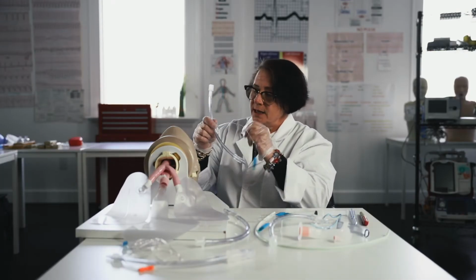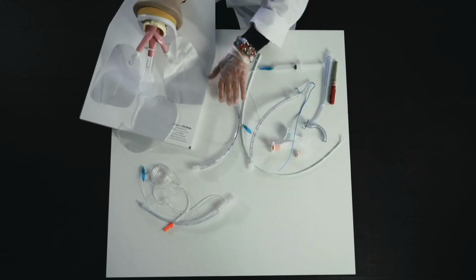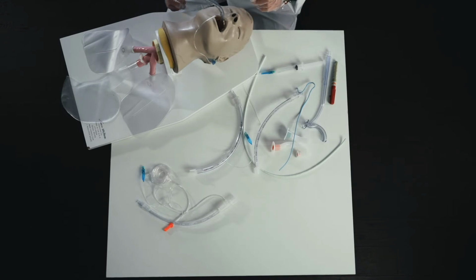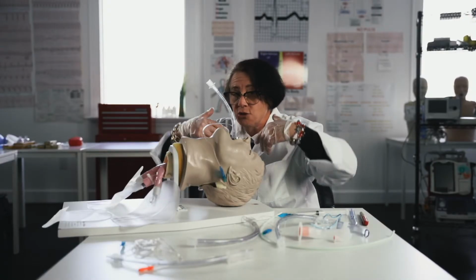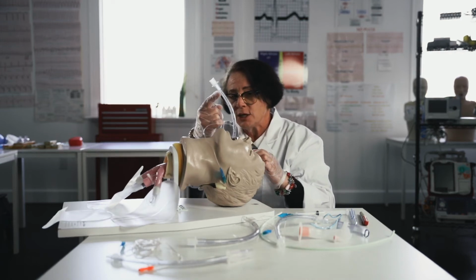So when patients are intubated, you're going to see a portion of the endotracheal tube sticking out of their mouth. As humans, we're not going to vary much between 2 centimeters above our carina and our lip or our teeth line. You would need a neck like Nefertiti or no neck. It's usually the no neck people. So just realize whatever size tube is in this patient, multiply that size by 3.